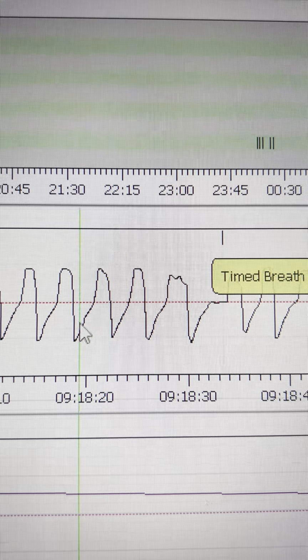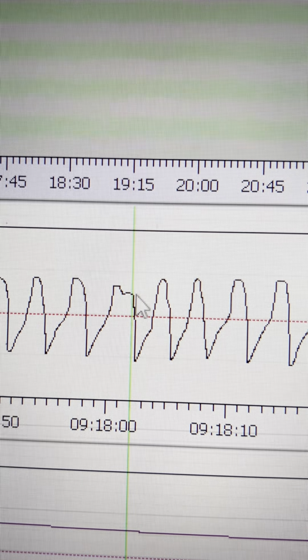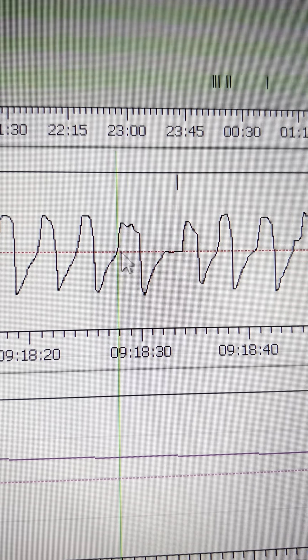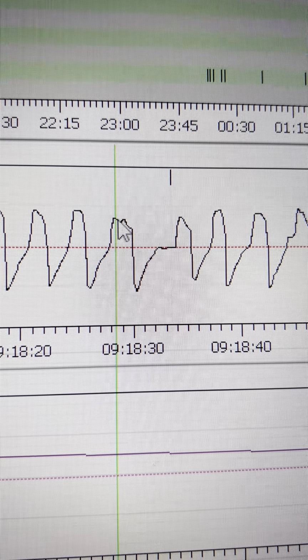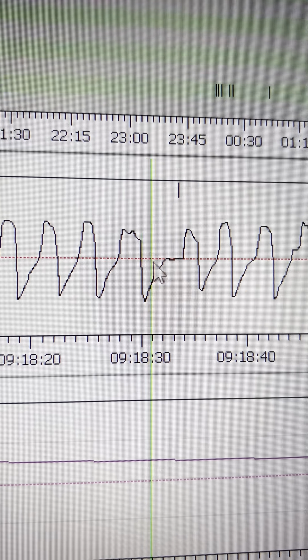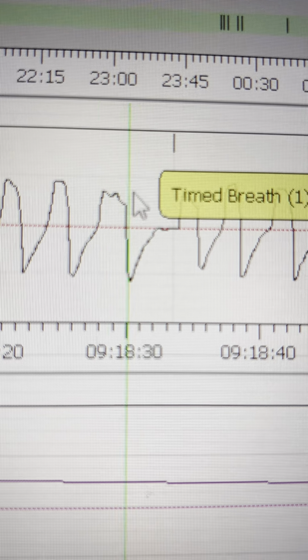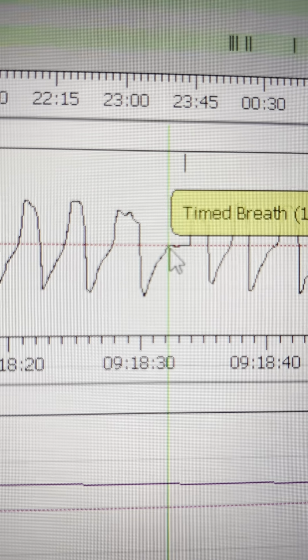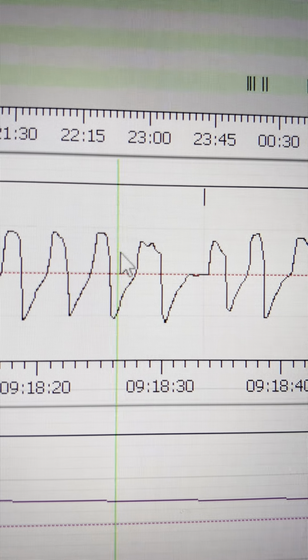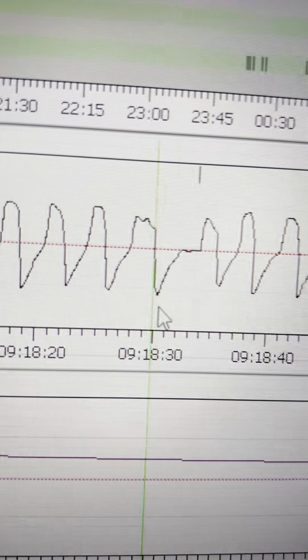You can see that I'm breathing in, and it gets cut off already here a little bit. Here too, a bit more effort, and then I can't. You can see right here, I'm trying to breathe in, it just stops. And it's really apparent here. I try a little bit more, but it doesn't work, even though I want to breathe in more. Here you can see collapse happens, because here my air hunger is big, okay? This is not a central. If it gets cut off before, then you're having more obstruction. If it's big and not cut off, then you're probably more likely to have a central. So those are the two opposites basically of what happens.